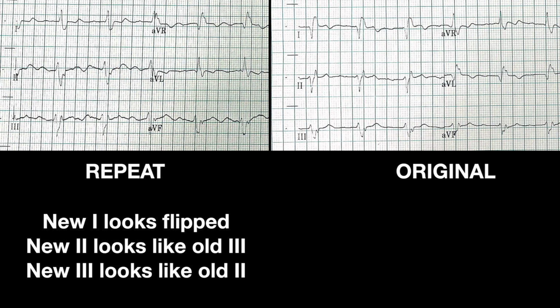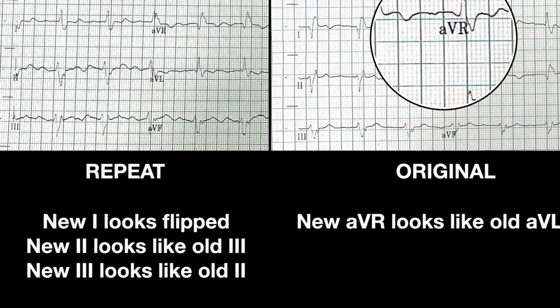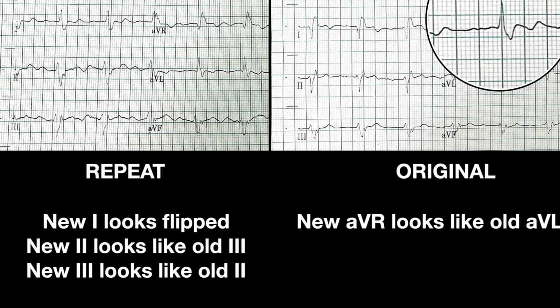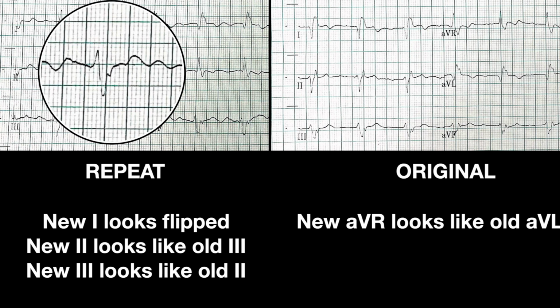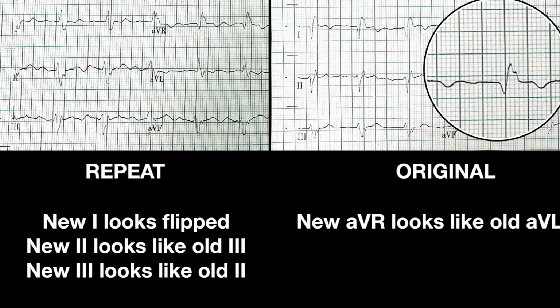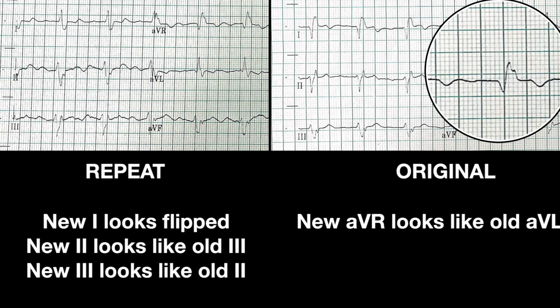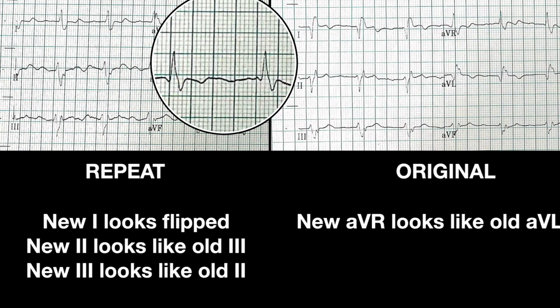Even when we look at the augmented limb leads, AVR, AVL, AVF, we can go through those relatively quickly. You notice that new AVR looks a lot like old AVL. New AVL looks a lot like old AVR: negative, positive, little humpy deflection there.